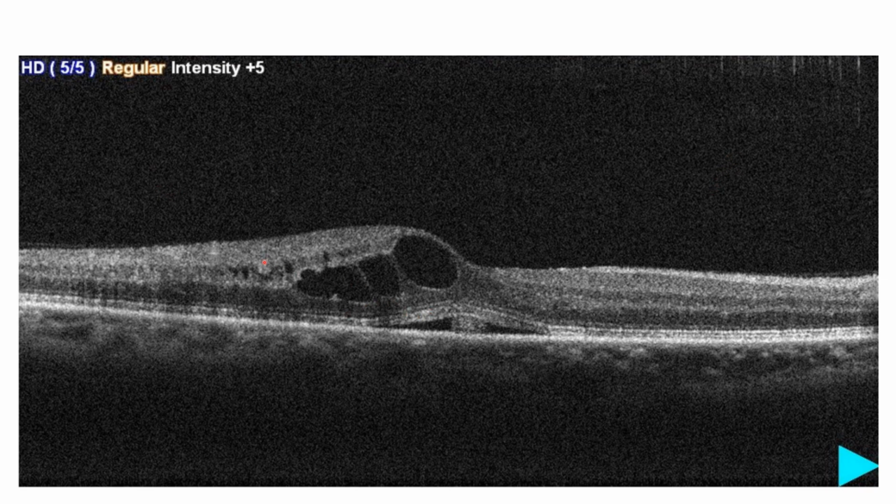And we can see not only that the retina is thickened in this area, but there is also cystic space in the retina, which indicates retinal edema. And also there is some amount of subretinal fluid here with some deposit in the subretinal space. So this is what a branch retinal vein occlusion will look like, where you have half of the retina which is normal and the other half, which is affected, has edema.